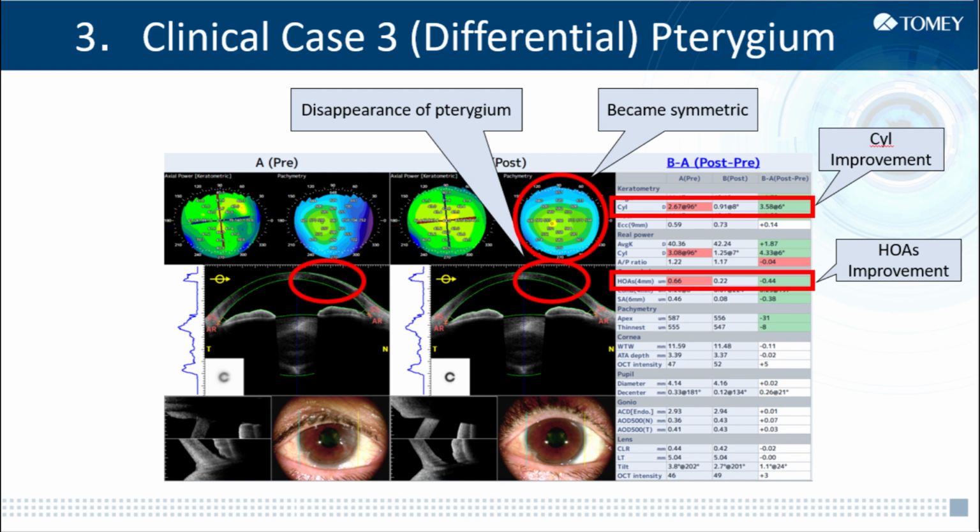As we can see from those clinical cases, thanks to the total analysis application, we can check summarized anterior segment information quickly. Color segmentation helps us to find abnormalities or changes of the anterior segment easily. We can realize early-stage disease by comparing left and right eye. And we can create a workflow that refers to total analysis first and then moves on to next-step diagnosis with a highly specialized application as needed.